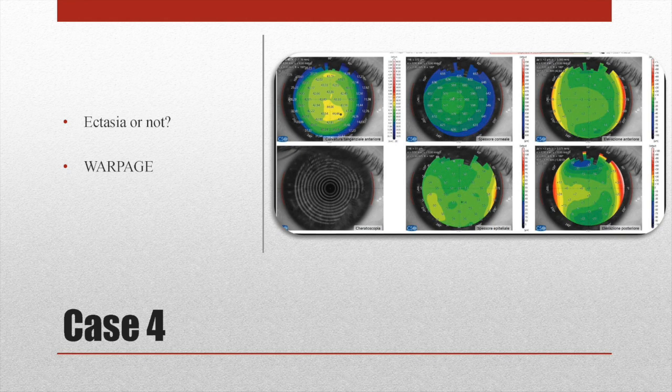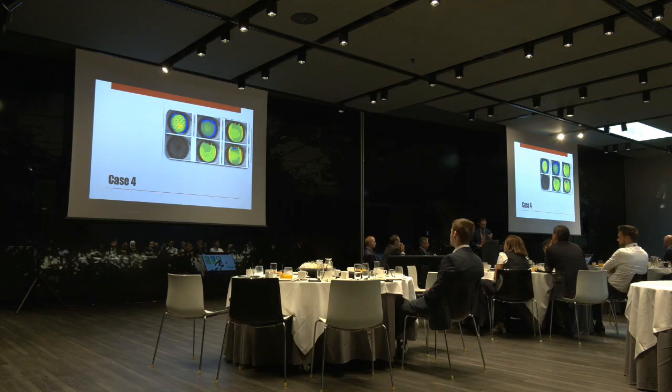What do you think about this one? So is this an ectasia or not? It's not, right? So here, epithelium really does make a difference a lot, because you see a thickening of the epithelium where it's supposed to be thin. And this is a warpage.